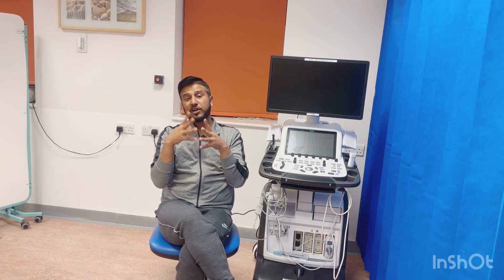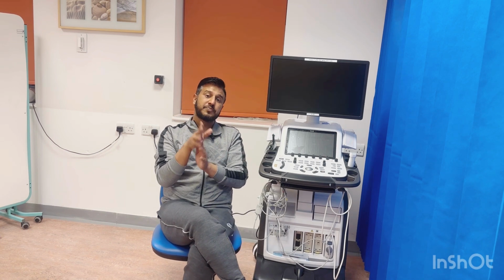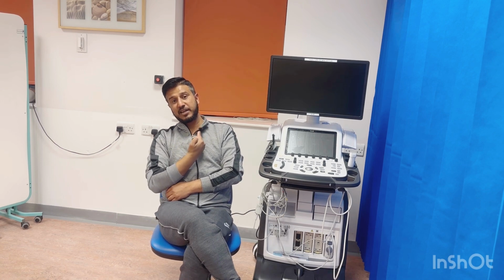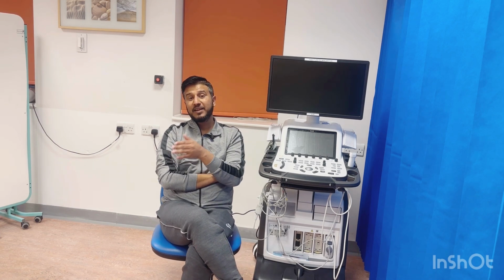But most of the cardiologists or most of the guidelines say that you measure it wherever you are seeing the bigger size and clear size. From the technical point of view, you need to go one space up where you see the ascending aorta proper, and you will measure it there. Okay, so this is mainly the etiology.